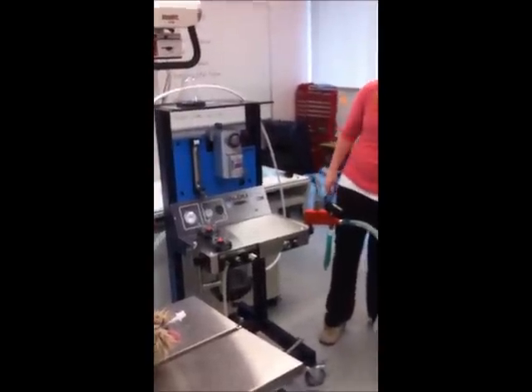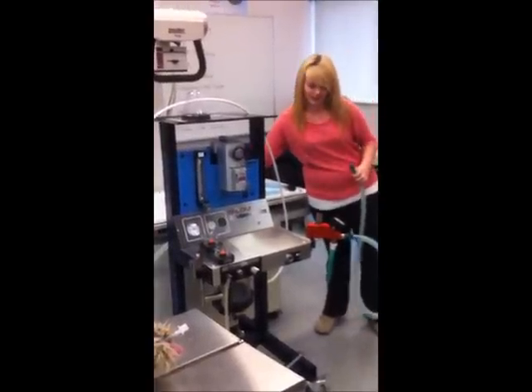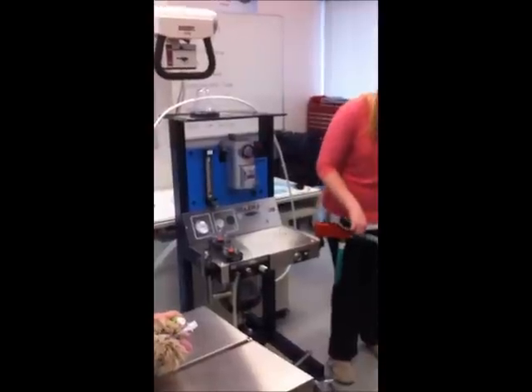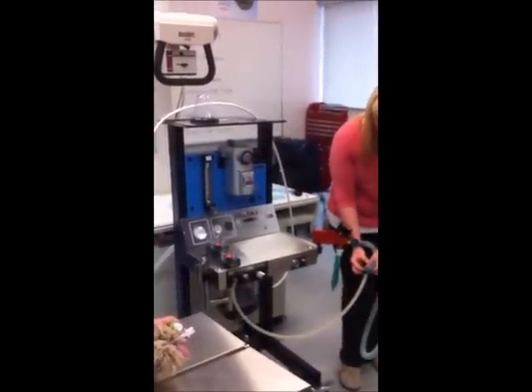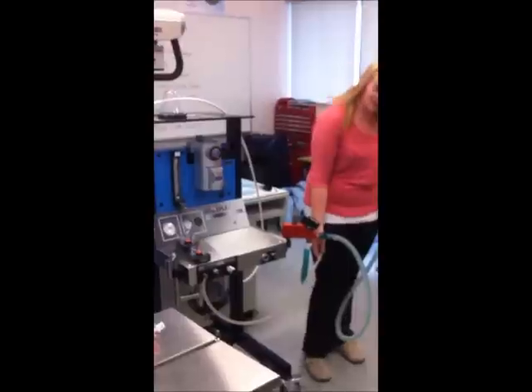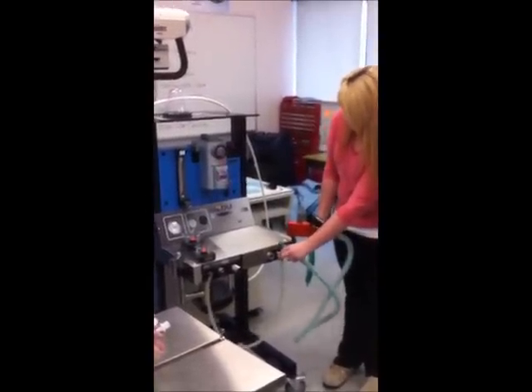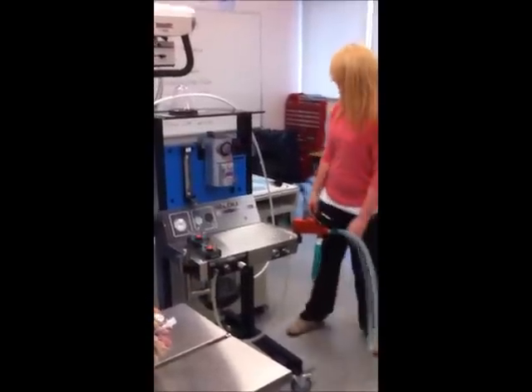Don't forget the first one. Do I see the ones connected to you? It goes on this part, but that should look different. The oxygen's connected to the flow meter. Yeah, the flow meter's connected to the vaporizer. But there's something that goes on here too. I can't remember what it is. Look on the table, what do you see?